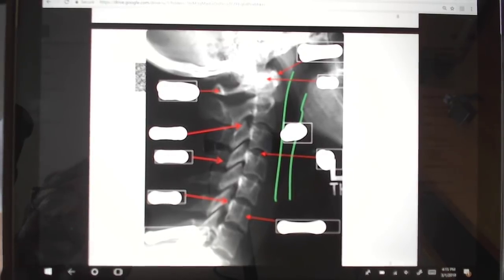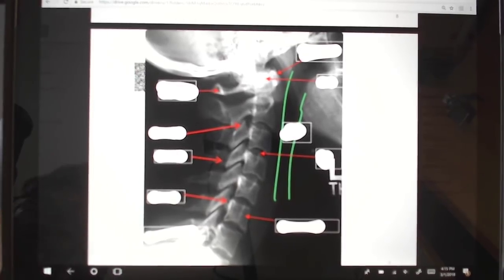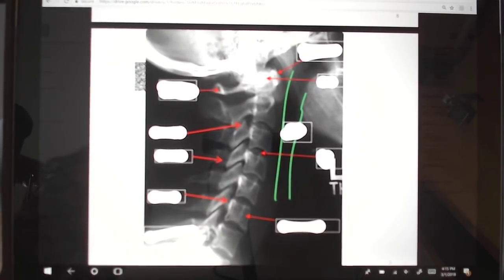So let's just start with the easy ones, which is probably the X-rays. Those are probably the easiest ones. I'll point out what you're looking for in each of these, and how to approach imaging scans. You'll get imaging scans on the exam and the practical, so it's good to know it.